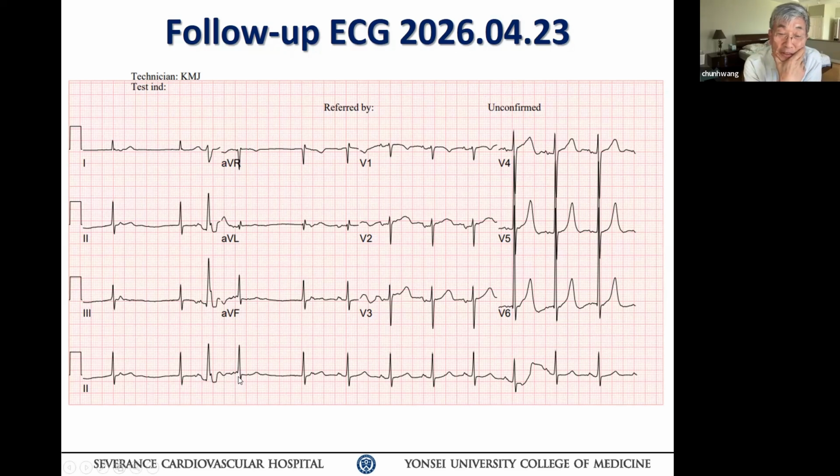You're assuming that probably came through close to the conduction system or a septal area, somewhere around that area, which may likely result in a junctional rhythm. So I don't think we can say, based on this ECG alone, that this is a sinus rhythm. You can only say it's a regular supraventricular rhythm, probably atrial rhythm, but I cannot rule out a PAC-triggered ectopic atrial tachycardia versus reentry. But I would favor reentry because it's so regular.